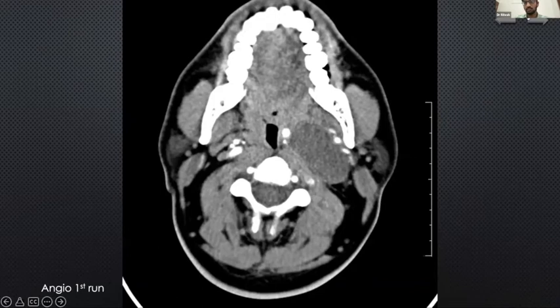Shall I show another picture? Now, is there any other finding in the tongue, because clinically you are showing something, no? Yes, sir. There is also atrophy of the left side of the tongue muscle. So what is the importance of that? Atrophy of the tongue with the neck mass. It might be possible from the hypoglossal nerve also. So that is a very important thing.